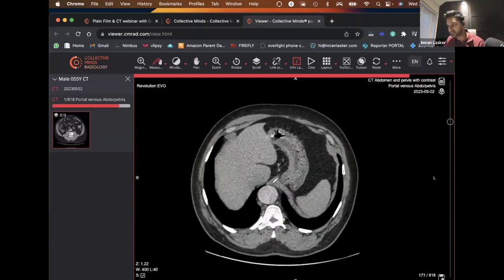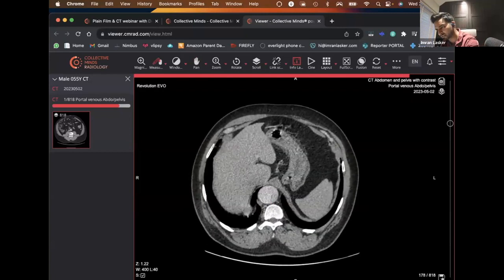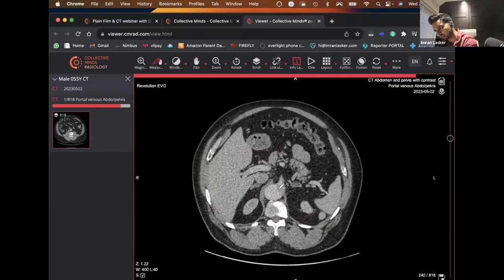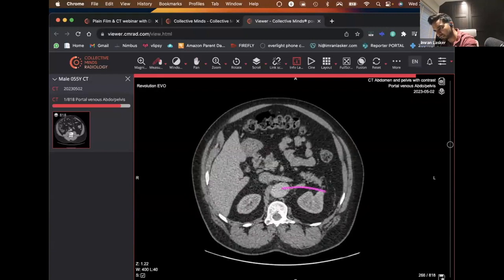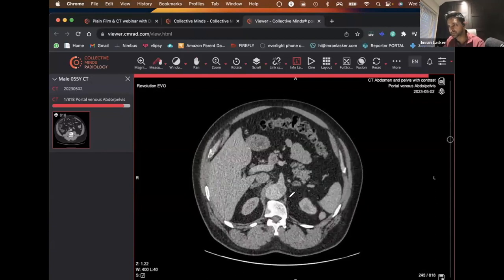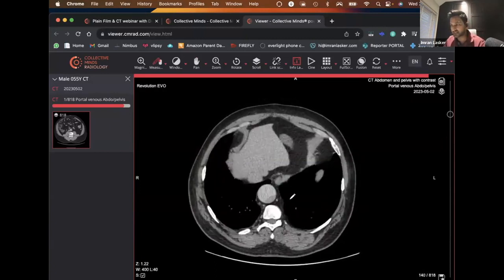As you scroll down further, you can see that this curves around this way, keeps going, curves around that way, and then it communicates with that area there. And then that communicates that way. There's almost like two different lumens that are communicating with different parts of the body, right? And so, yeah, everyone's right. There is an aortic dissection.